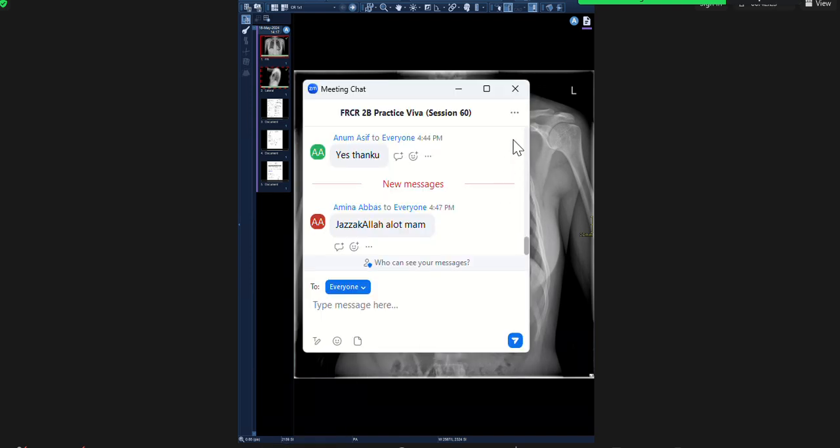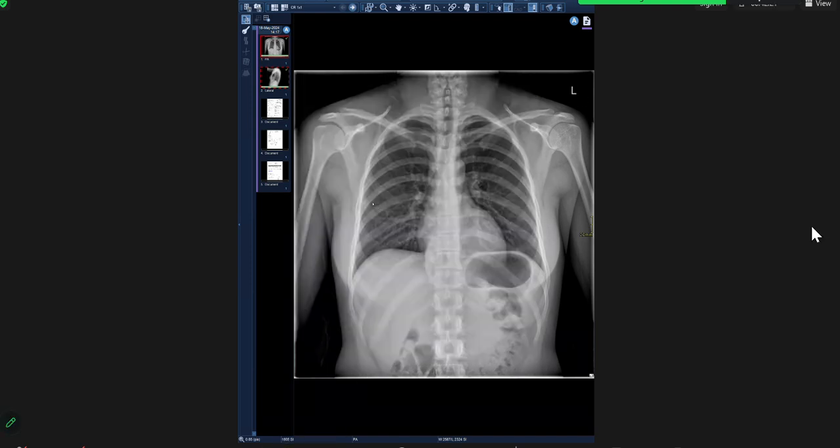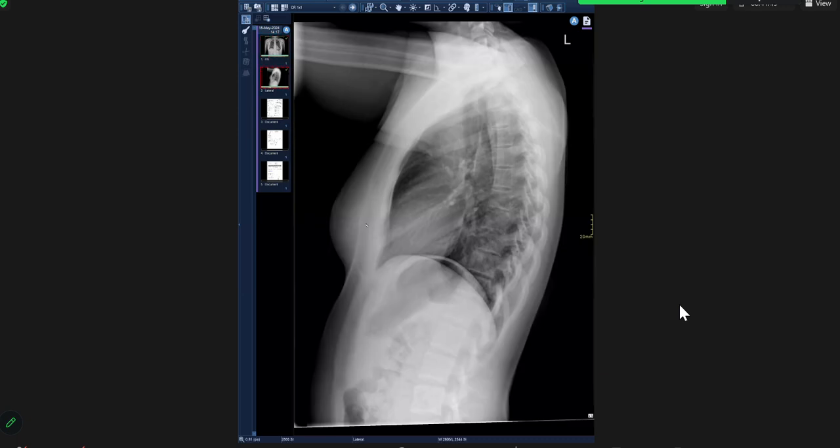This is your second patient. Ma'am, this is a chest X-ray frontal projection of an adult female patient in which I can see there is a paraspinal radio opacity along the D10, 11, and 12 vertebral bodies, and this is likely a posterior mediastinal mass, and the rest of the lung fields, the visualized bones and upper abdominal structures appear unremarkable.